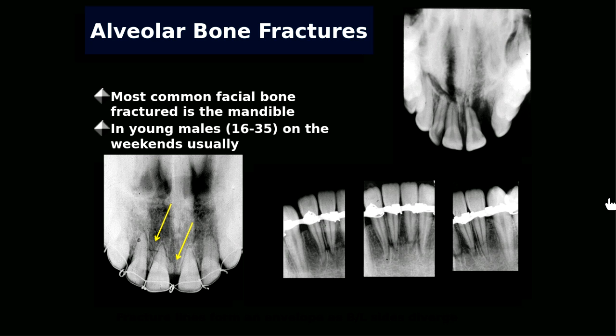Let me check that. I hope you can see that. Okay, there we go. So let me check that area.